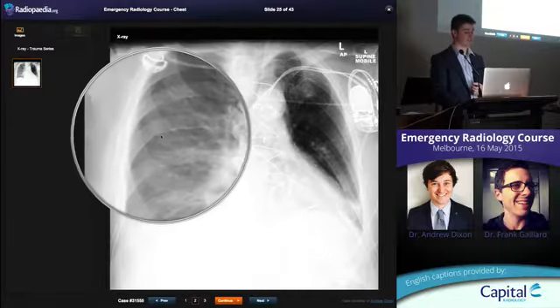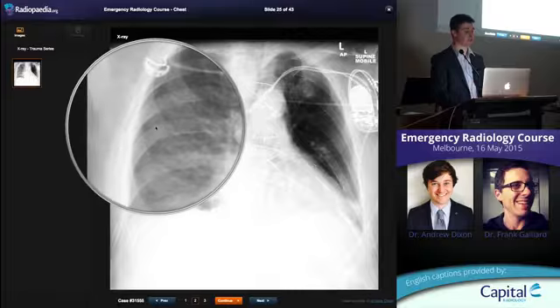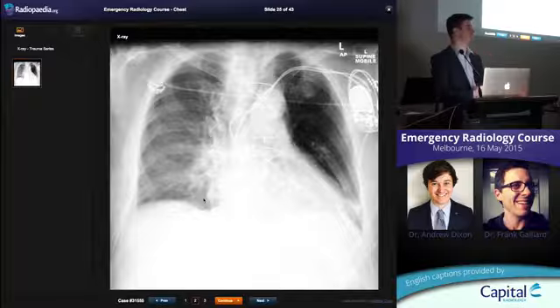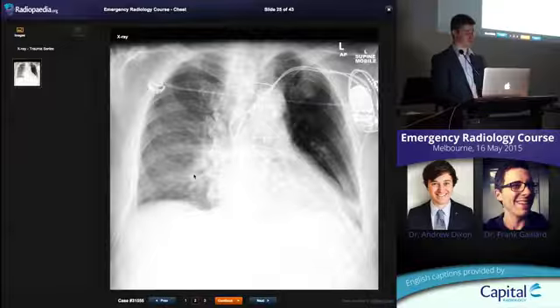If you trace this rib, you can see that it does a little angulation there. See the top of the rib, and then a little angle, so he's had rib fractures. Okay, and he's got this general increased density to that right hemithorax. That's very suggestive of a hemothorax on that side. Okay, in the setting of trauma, you would call it a hemothorax rather than a pleural effusion.